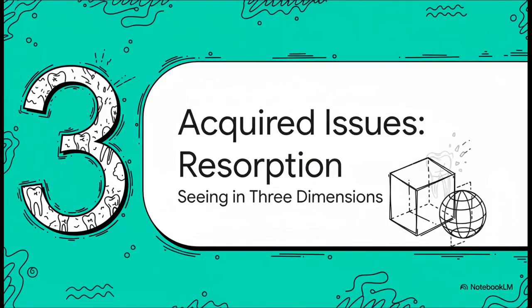All right, let's level up and talk about a much trickier diagnostic challenge, resorption. This is where our standard 2D tools, as great as they are, really start to show their limits.